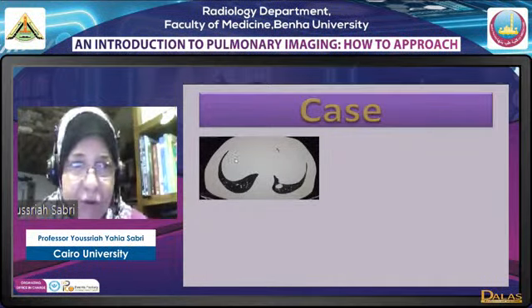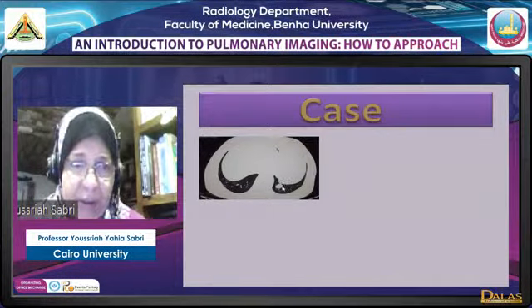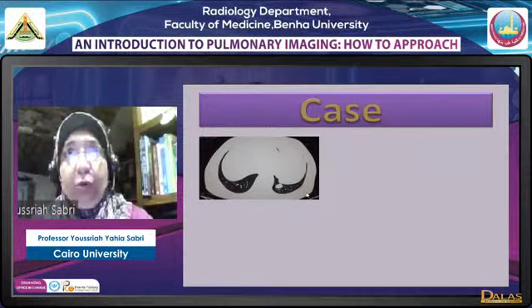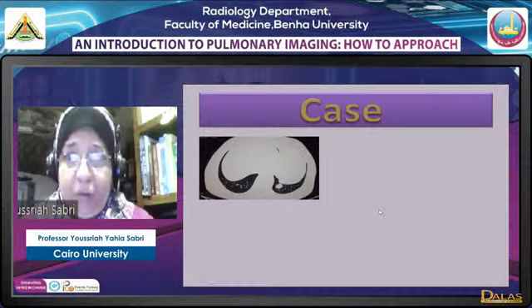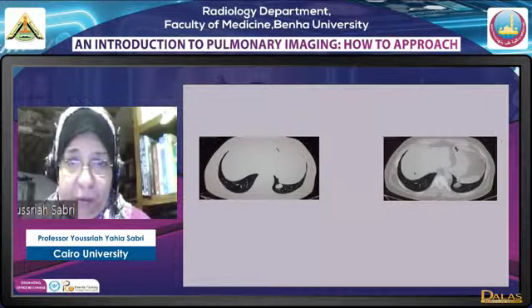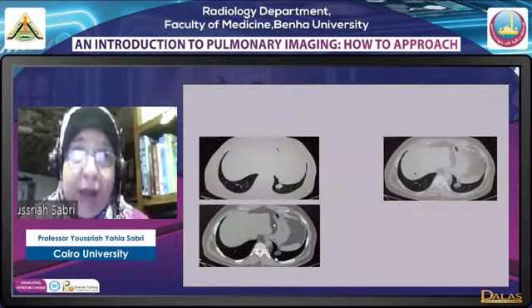Again, this patient had high resolution CT, and we incidentally discovered this left basal nodule. High resolution CT is not supposed to assess masses and nodules. So we changed the window, and we started examining the lesion with a normal lung window. We found that the content of the lesion suggested fat. So we shifted to the mediastinal window. Okay, there is fat. Are we dealing with a hamartoma?